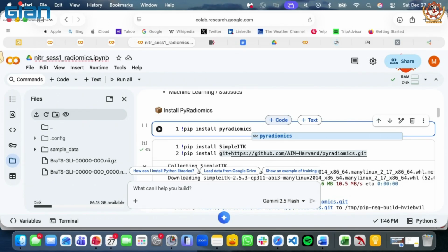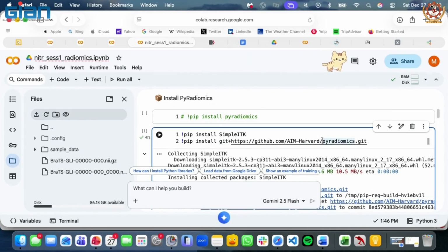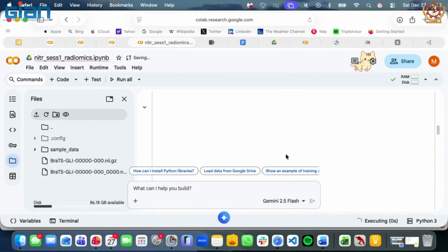So as of now, don't use that. If you are trying to extract radiomic features in your local environment, by local environment I mean, similarly, install Anaconda, make a Python or a Conda environment and then install PyRadiomics there, you can manually change the NumPy version, or just, very simple, use this pip install git+https://github.com/AIM-Harvard/pyradiomics.git. So again, similarly run this.